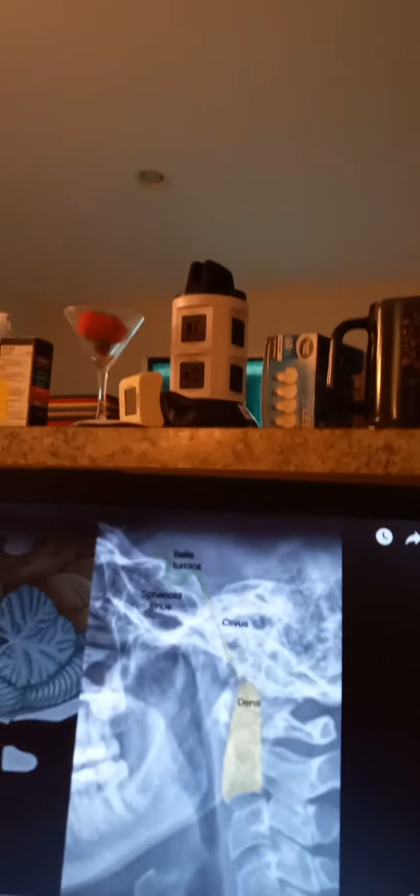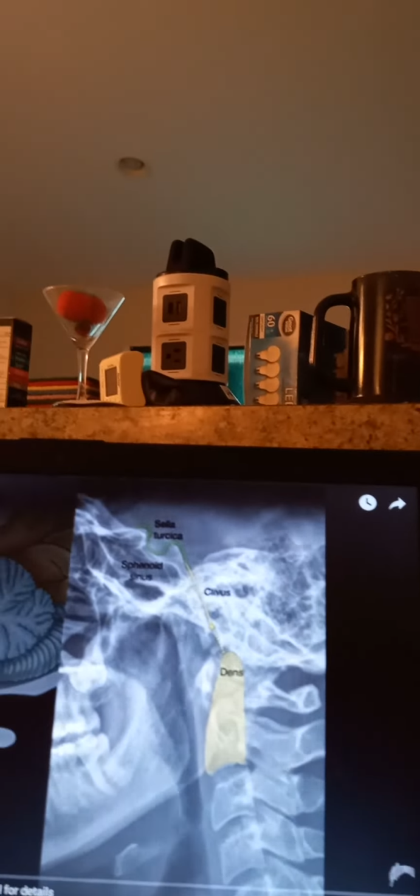That was fun. Let's do it again, except with this illustration. That there is the sella turcica housing the pituitary gland. Deep to that, or inferior to that, is the sphenoid sinus, and along that posterior border, there's the clivus. Now this could be a child's X-ray too. I don't know.